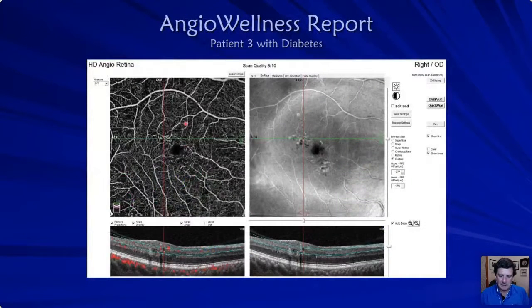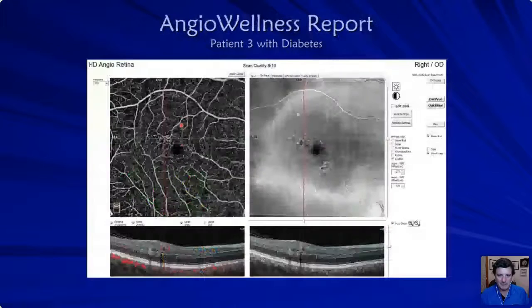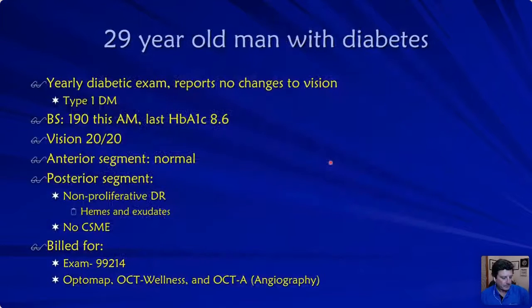And this is the patient here. Remember now, whenever I looked at this, I said, oh, come on, there's got to be some vascular changes. Oh, yeah, when you look at it underneath and clicking on right here, custom, and I'm looking kind of at a very narrow band through here. You can see what's happening in the B scan. You can see now the capillary changes. It's creating this exudate in this type of blood that's occurring. And again, there's just cases where this has been fun in the practice.